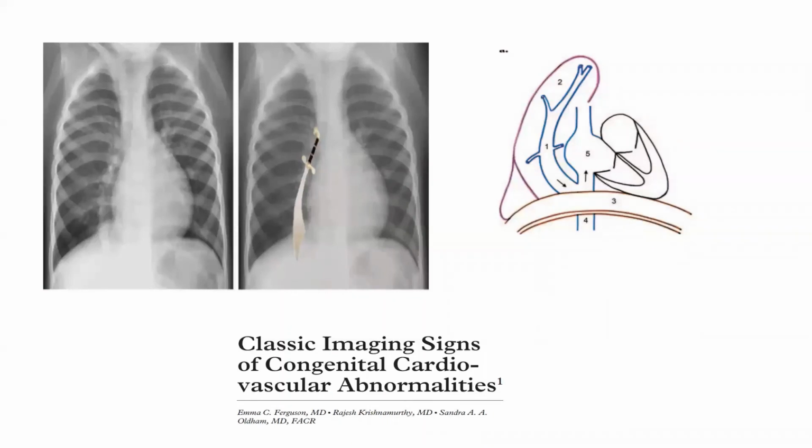You see here, the pulmonary vein, instead of going to the left side, goes to the IVC, so it gives this course. So it is anomalous pulmonary venous drainage into the IVC, giving a scimitar-like density, which is a Turkish sword. And it's associated with lung hypoplasia and all of that.